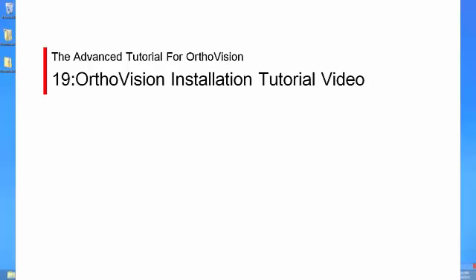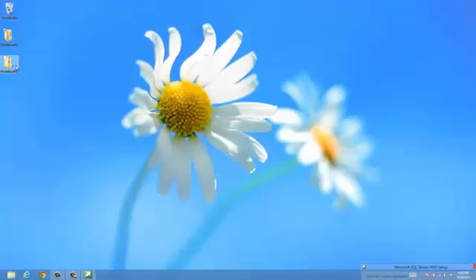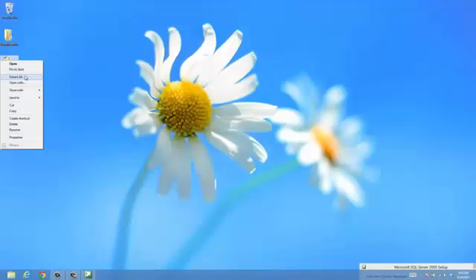Welcome to OrthoVision's installation video tutorial. To begin, make sure you first extracted the OrthoVision zip file which you've downloaded. To do this, simply right-click on the file and click Extract All.